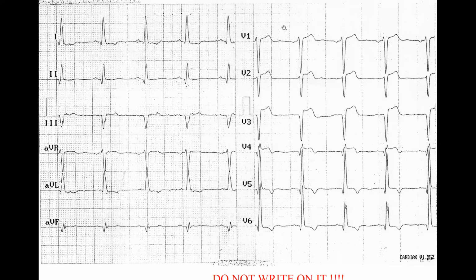Do you see a wide R wave in V1? No, you don't. You do see it in V6, and especially a notched one, so it can be a left bundle branch block. Okay. Next one.